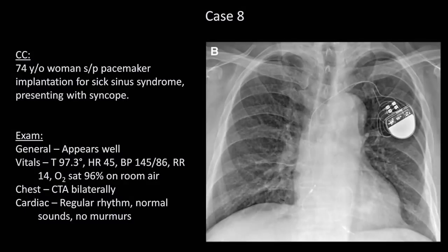Case 8. A 74-year-old woman, status post a dual-chamber pacemaker implantation for sick sinus syndrome, who is now presenting with syncope. The first thing to notice here is that there is something fishy about the wires coming out of the generator, particularly this structure here. What is that?